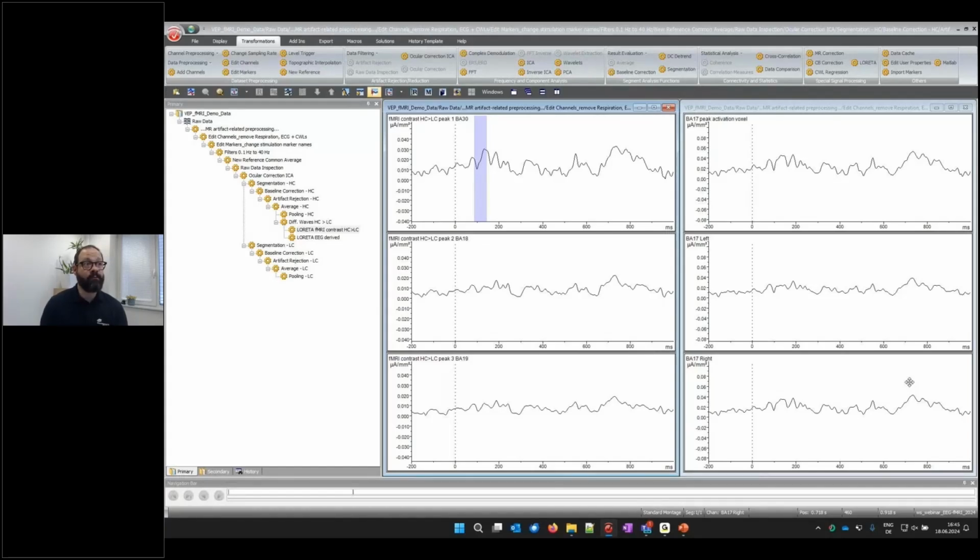However, by using the fMRI peaks, I get something that is a little bit more, let's say, localized than what I got out from the EEG, because I have a bit more of a diverse information here from the fMRI clusters where they are, while I would, due to the coarse model in LORETA, probably not get this nice spatial resolution inferred from the transient LORETA. So this is definitely a plus.